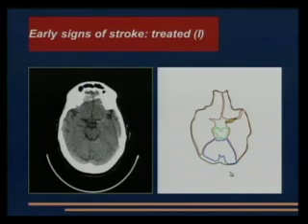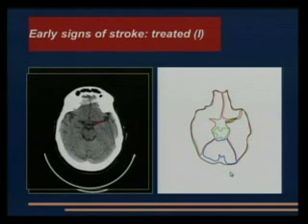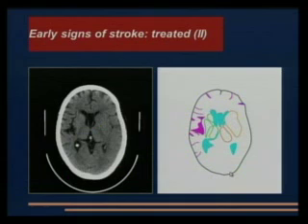So it was contraindicated according to the rules, and this was the mother of a secretary of this department. So Dr. Schoenholz, at that time the interventional neuroradiologist, decided to treat the patient. And this is the sign. You see the effacement here of the external capsule. In here you can see an internal, and here is the blur.